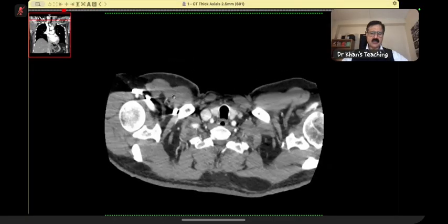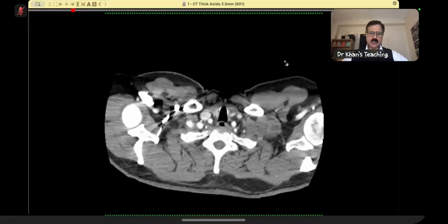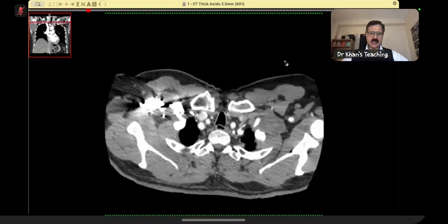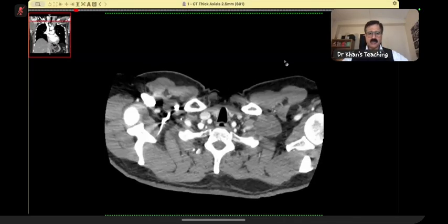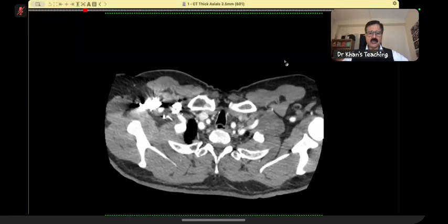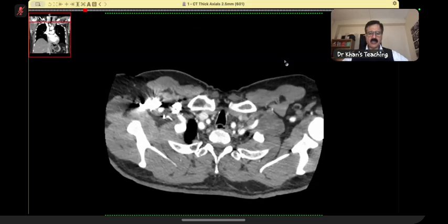The point here is that the brachial plexus is slightly beyond the 2B level, where nobody is expecting you to know the nitty-gritties of the brachial plexus, but a mass in that region is definitely 2B stuff. You have to pick up a mass there. And you have done very well. The only thing is that you did not know the anatomy of the brachial plexus. Simple as that. Otherwise, you had picked it up.